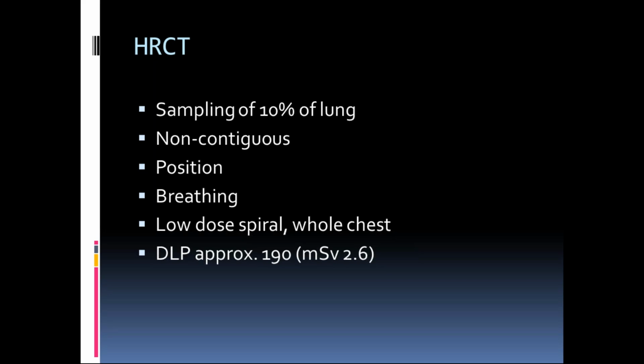Now, for first-time customers, as I call them, I do a low-dose spiral based on the lung cancer screening parameters, and I do the entire chest. The reason is it gives me a better idea of zonal predominance through the chest, and it also gives me an out, taking a look at the whole lung when internal medicine or another general doc orders it inappropriately and they should have just gotten a low-dose chest, so I don't miss those nodules.